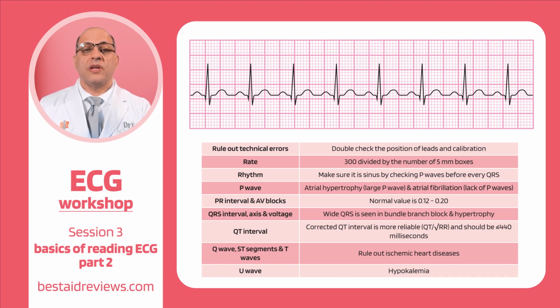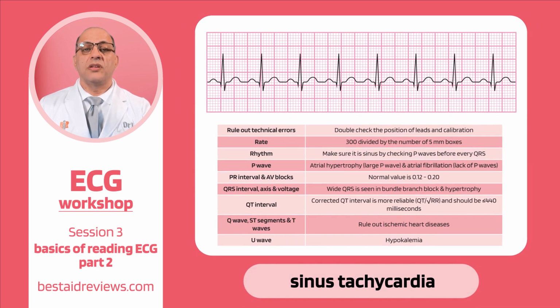So to wrap it up, here we can say that this is sinus tachycardia. The causes for sinus tachycardia include fever, exercise, hyperthyroidism. So usually in a hospital setting, if we see sinus tachycardia, it is associated with fever. Even stress can do that.